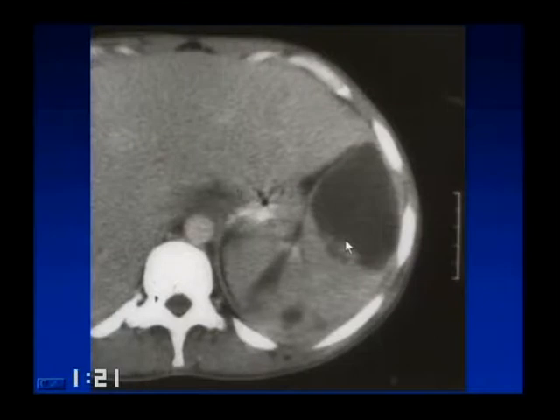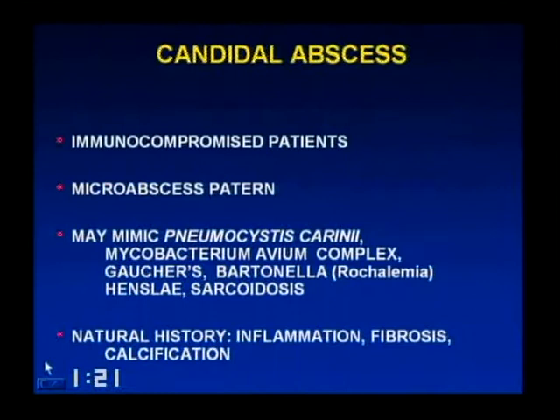This is a patient who was an IV drug abuser with staphylococcal abscesses. There are multiple abscesses, and in one area there is certainly an infarct with a typical wedge shape. One special case that deserves attention is the concept of microabscesses, or small little dots studding the spleen. These are often immunocompromised patients.